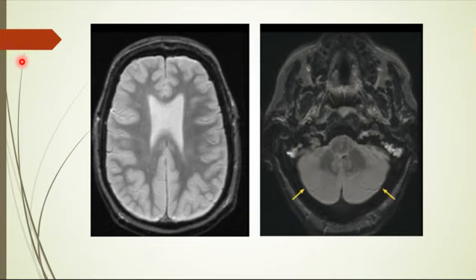General, diffuse. While the cerebellum is dark, okay? It's called dark cerebellum or black cerebellum sign, okay? Which is exactly the opposite of what you see in the CT scan, the preserved cerebellum or hyperdense cerebellum sign.